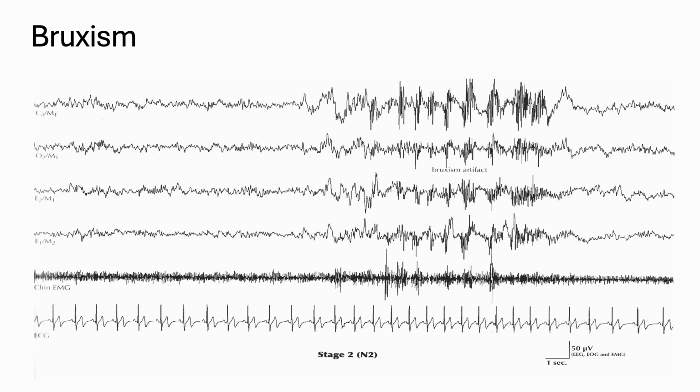So why does it show up in the EEG so well? Well, if you put your hands on the side of your head so that the fingers almost meet at the top, clench your teeth, you can feel that tension go all the way up through the sides of your scalp. And that's what's happening in these electrodes. There is muscle tissue, and it's flexing.